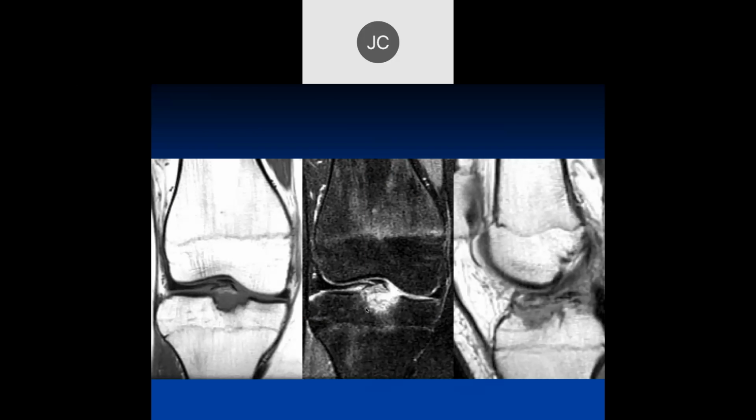Here we see another ACL avulsion fracture. This one is displaced, as we can see here. This is a rare one in adults. It's very uncommon to have these bony avulsion injuries in adults. This is more a pediatric injury. With a displacement like this, these typically need surgery, but it's not a graft placement. You tack the bone down because bone heals very well to bone.